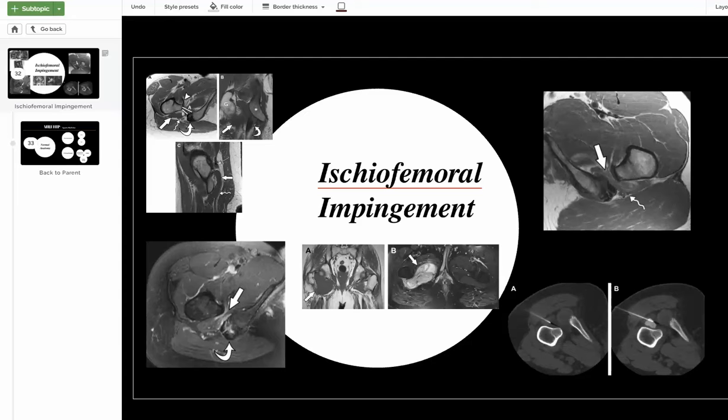Patients with ischiofemoral impingement present with chronic pain in the groin or buttock, usually without precipitating injury. The pain may radiate distally to the lower extremity because of the proximity of the quadratus femoris muscle with pressure effect on the adjacent sciatic nerve. Plain films are often non-contributory. MRI is the standard imaging method to diagnose ischiofemoral impingement. It shows edema and deformity of the quadratus femoris muscle belly at the site of maximal narrowing. In patients with long-standing impingement, quadratus femoris muscle fatty infiltration and atrophy may be present.